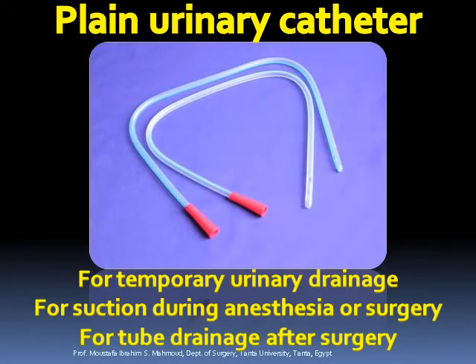Plain urinary catheter for temporary urinary drainage, for suction during anesthesia or surgery, for tube drainage after surgery.